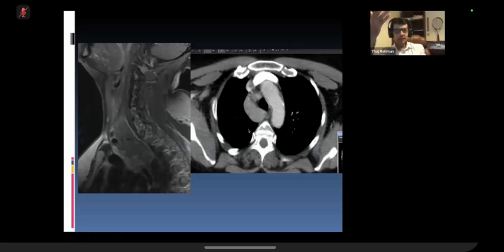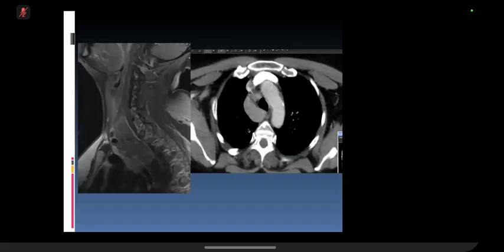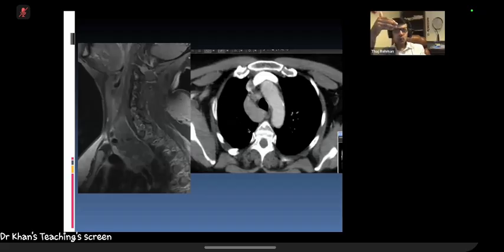Ganglioneuroma was one, I think. Ganglioneuroma or a neurogenic tumor. Like, it can be a neurofibroma. Although Chapman gives ganglioneuroma, but it can be a neurogenic. I would just say neurogenic tumor and don't bother anything further than that. And I think abscess was one. Yeah, but abscess is usually related to the bone, isn't it? Abscess in a posterior mediastinum usually comes from the spondylitis or discitis. So I would put it along with the bones, and there will be bony destruction and so on.